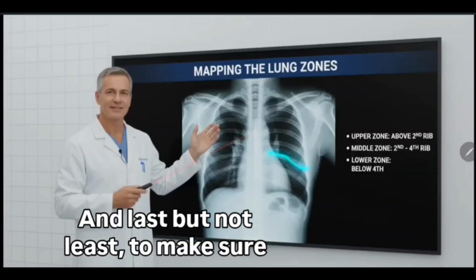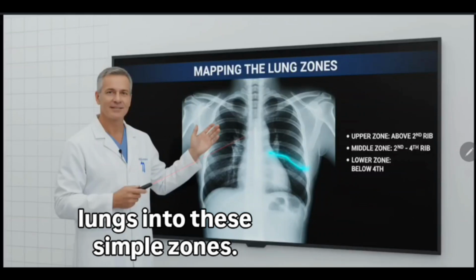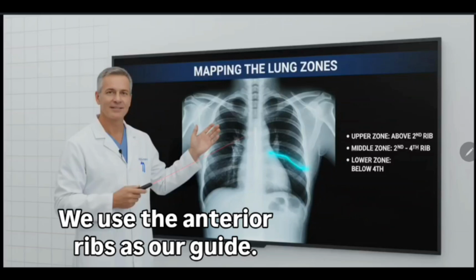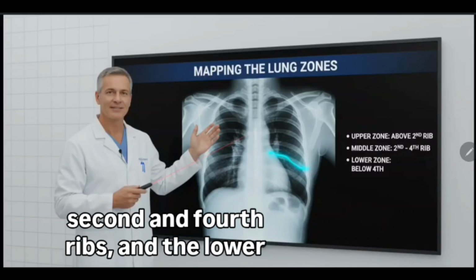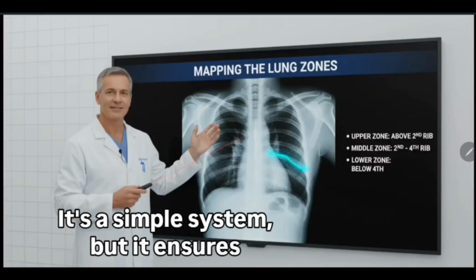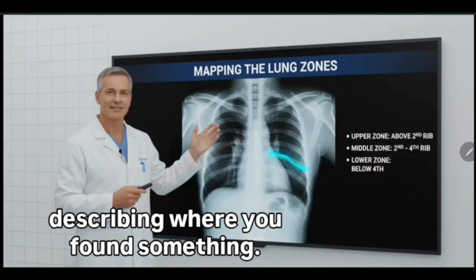And last but not least, to make sure we're all speaking the same language when we describe our findings, we divide the lungs into these simple zones. We use the anterior ribs as our guide. The upper zone is everything above the second rib. The middle zone is the area between the second and fourth ribs. And the lower zone is everything below that fourth rib. It's a simple system, but it ensures everyone is on the same page when you're describing where you found something.